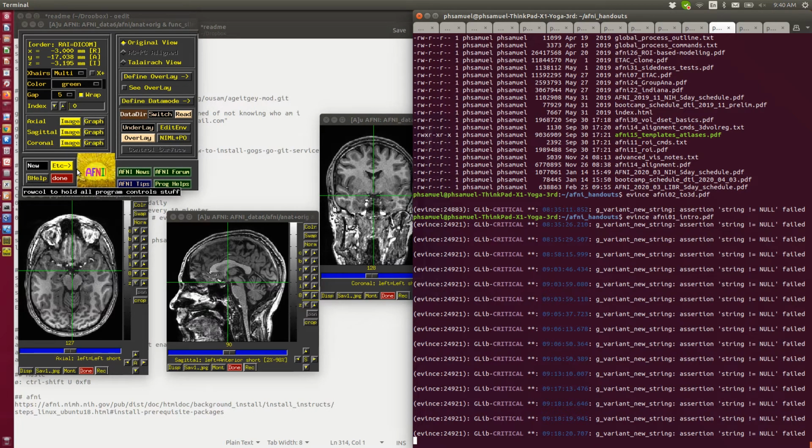Slices like this direction, across the top from the nose to the occiput, are called sagittal. That goes with the sagittal crest. That's how I remembered it when I first started. The sagittal crest is what the gorillas have. I guess we're not gorillas because we don't have one. And this one is called coronal, which is like face on.